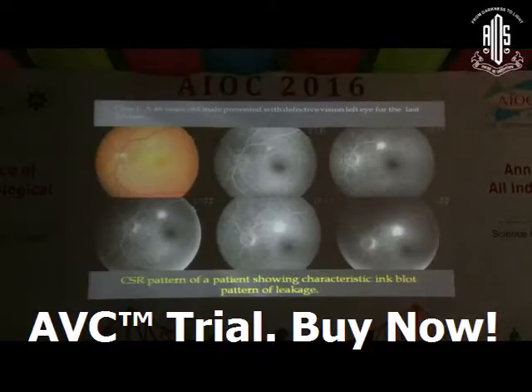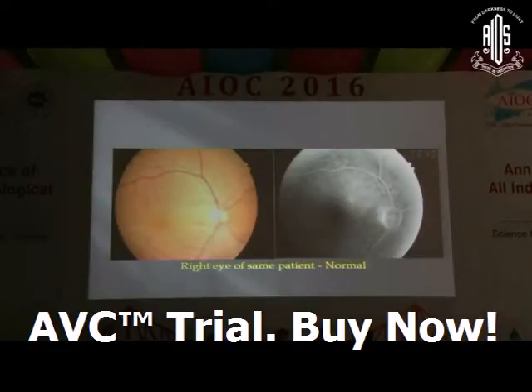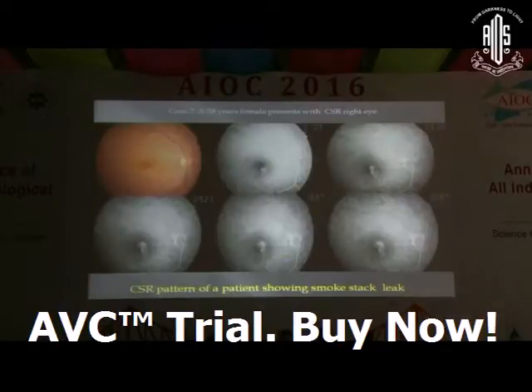Now coming to a few of my cases. This is my first case, a 46-year-old male presented with defective vision in the left eye for the last, say, 3 weeks. The CSR shows a typical ink blot pattern of leakage. As time passes, the leakage spreads in all directions. This is the right eye of the patient, it's normal.